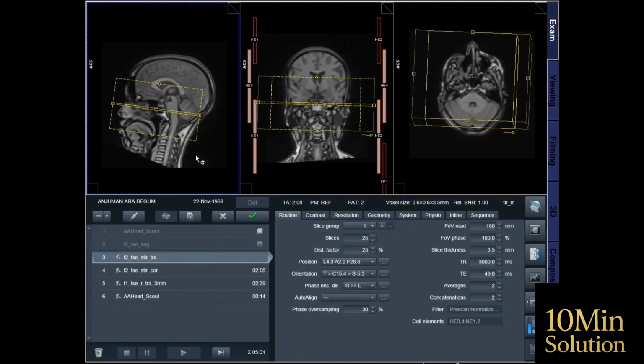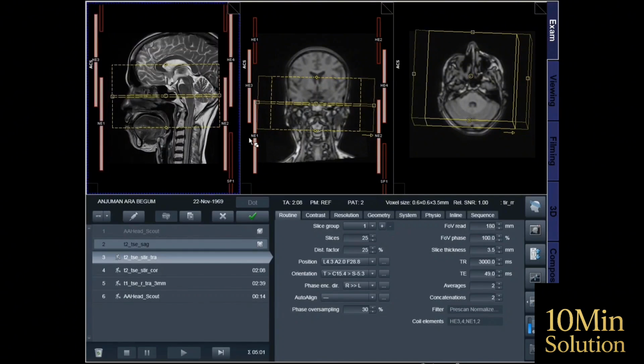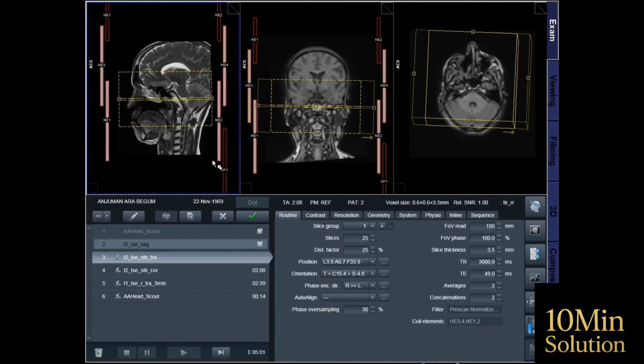Now we will set the plan for one section. We have come from the sagittal mini master. Let's bring it up on the screen. This is the T2 sagittal image, and we will do the PNS planning. The planning for this section will be done on the sagittal and coronal views, and we are arranging the plans very nicely by following the anatomical positions. Take a look.